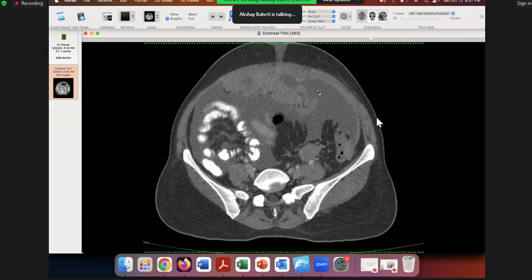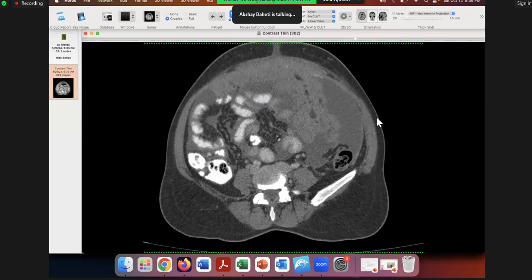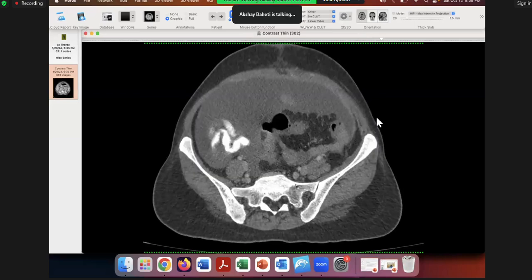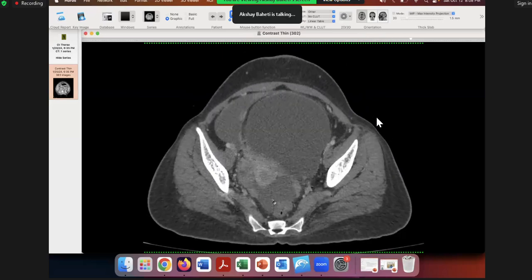Okay, so that's still the omentum here. That's still the peritoneum here. That's still the mesentery. And then as you go down, this becomes sort of the mesocolon now, right? So this is all mesocolon now. Okay, and then POD. So POD will often have deposits because this is the dependent site. So look very carefully at the POD.